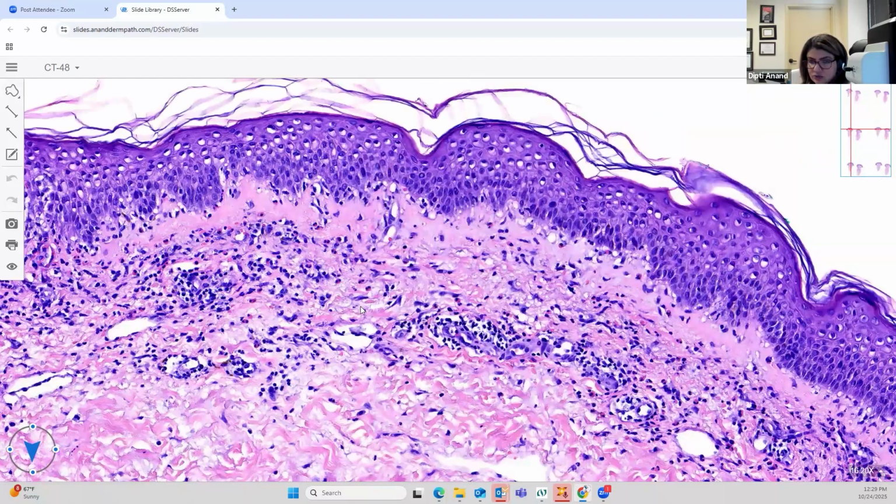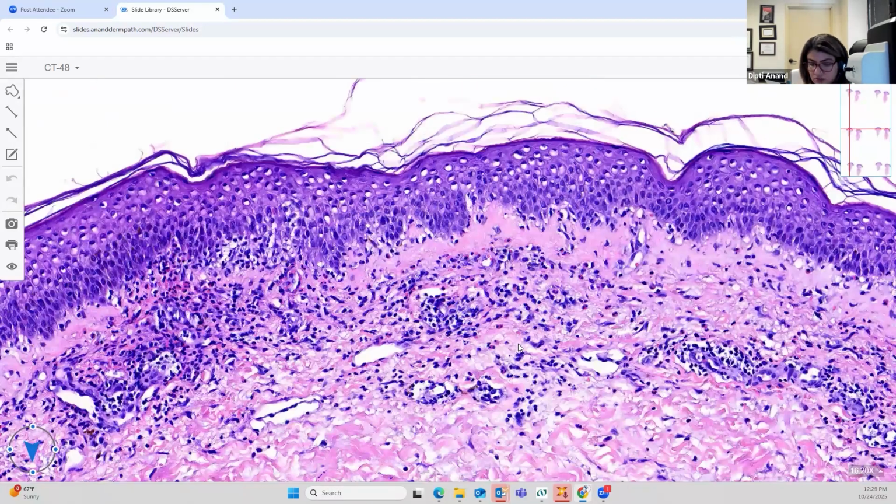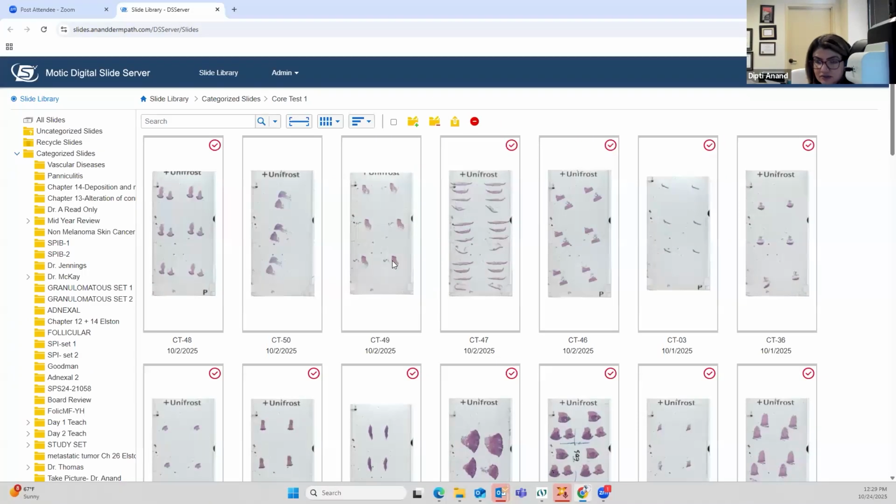When we see something like this, when we see very quiescent epidermis with EOs lining up along the DEJ or going up into the epidermis and in a band-like distribution, you always think about prodromal BP. So the answer is prodromal BP, and loop diuretics are notorious for inducing BP. So that would be the trigger. Patient recently started the loop diuretic therapy. Okay, so let's go to the next one, which is 49.